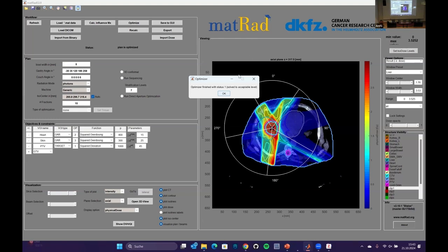And now what happened, just to go away from this anecdote, we just added this tiny heart objective, but it acts really strong and makes it very difficult to model this boundary here. Yeah, this boundary between heart and target. So you want a very low dose next to a high dose. And if you enforce this too much, this can really become difficult to solve for the optimizer.